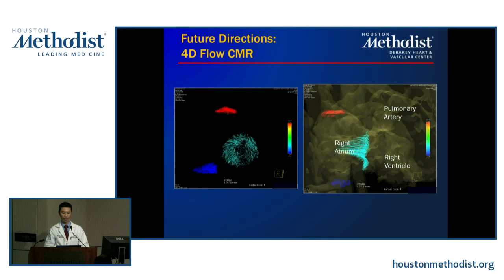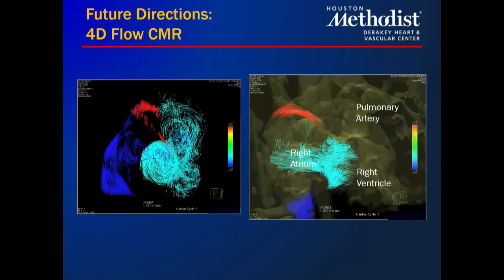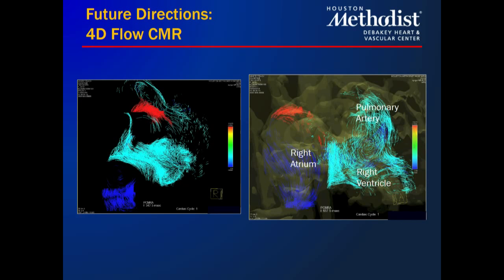And last but not least, there's 4D flow. This is courtesy of Huey Lin, one of his patients imaged here, showing the different flow properties that can be acquired and the characterization that can be done.